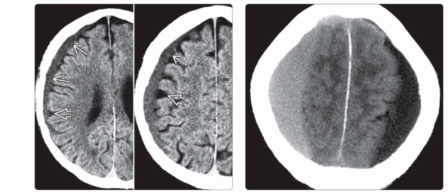The right subdural hematoma is subacute, that is, it is isodense with the underlying brain, and the left-sided collection is more chronic appearing. Note the severe compression of the underlying brain and sulci, and the falx is also partially calcified.